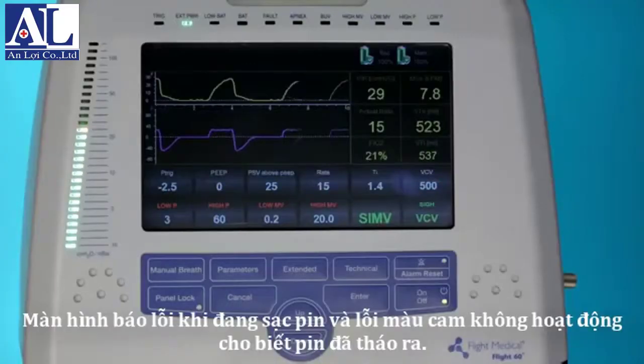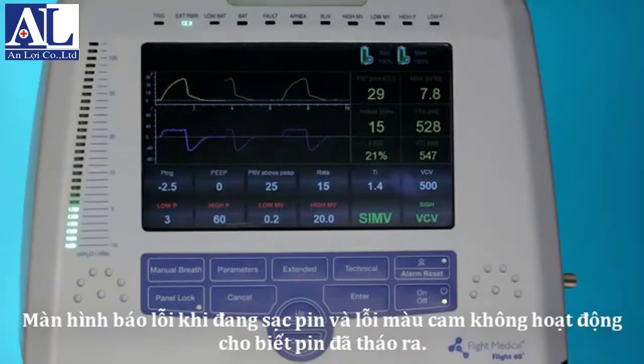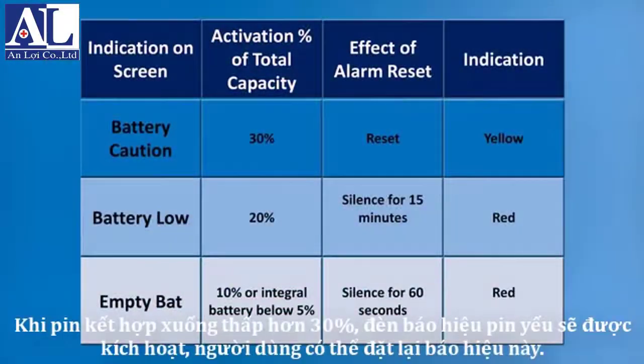The display of an upwards arrow indicates that the battery is charging, and a downwards orange arrow indicates that the battery is depleting. When the combined charge of both batteries is less than 30%, a low priority alarm is activated. This alarm can be reset by the user.